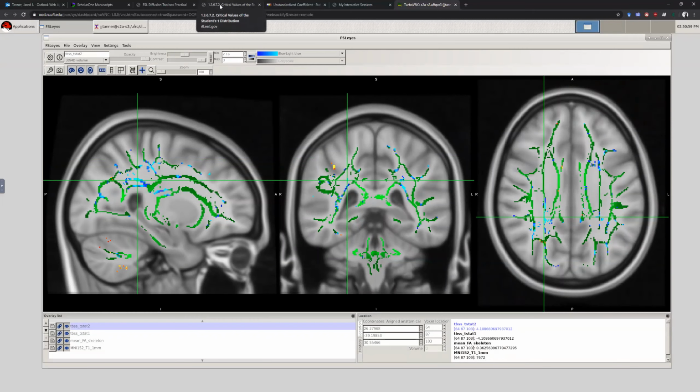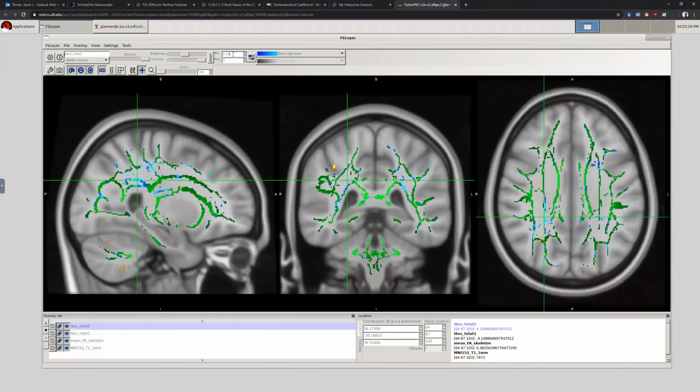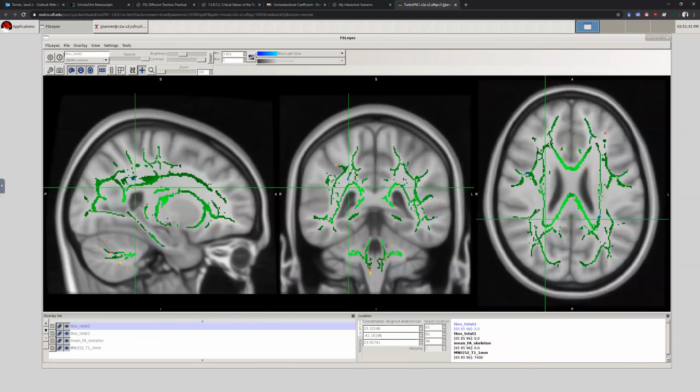You could also say, well, we're not correcting for multiple comparisons, so maybe we want to be even more stringent. So 3.852. Well, I'm just going to run this. I don't know what we'll get. 3.852. And then we'll put our maximum up to, actually going to go up to 5. So we get a little bit of variation. So in this case, we still see a few spots of differences. This is uncorrected P of less than 0.001, which is fairly robust, and those are even potentially publishable.